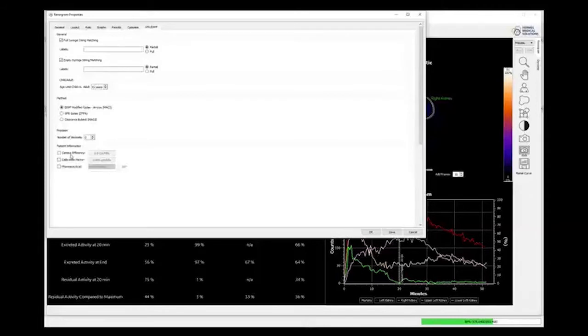It's not used very widely, but I know a couple of our customers are using it, and it relates to the camera efficiency factor that you can now store within the user protocol. Previously, you had to manually enter it for each case, which was a little bit cumbersome. So it's really nice to have that functionality to be able to store it now.